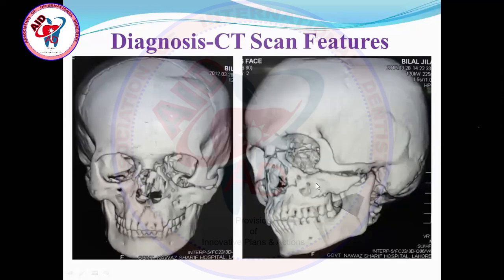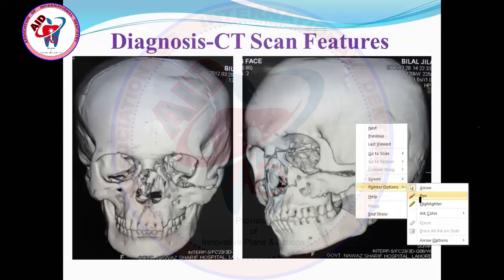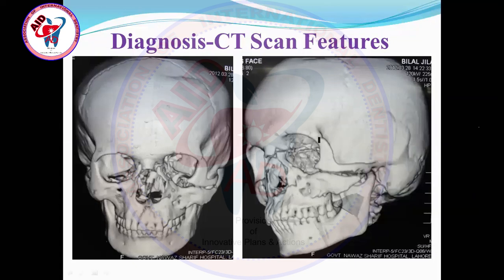This is an atypical zygomatic bone fracture. This is not a typical fracture. Usually, what we have seen in the previous slides is that the zygomatic bone gets fractured from its articulations. Articulation means from its sutures with the other bones. But here in this scan, in this 3D evaluation, the frontozygomatic suture is intact. Some portion of the upper body is intact. The whole arch is intact. But the fracture line is going through the body of the zygoma. Usually, this type of fracture is not there.